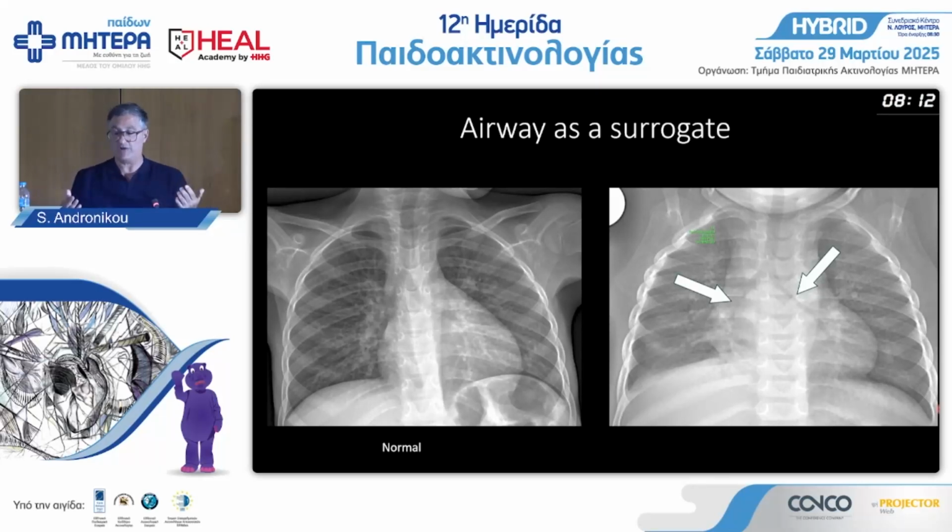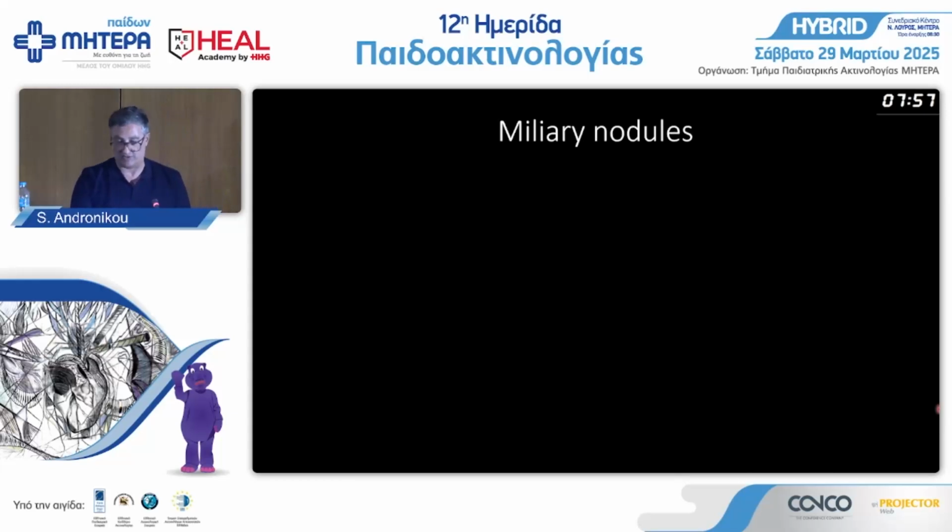How do I know they're narrow? Because the left main bronchus becomes bigger again, more distally. You know, trees don't go thick, thin, and then thin, thick again. You know, they go thinner as you get wider. So this is a bronchial tree, and I suggest you look at your airway religiously for tuberculosis.